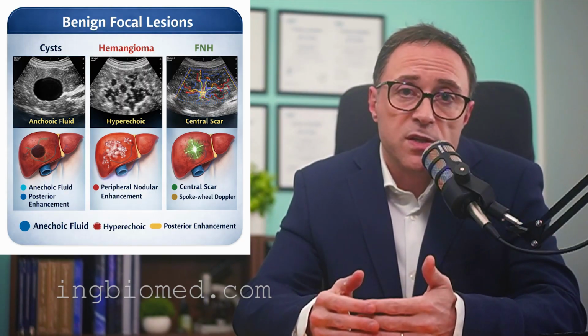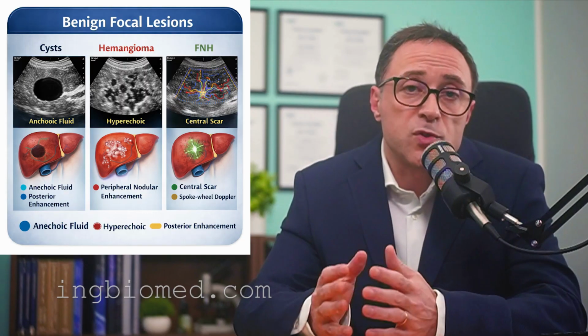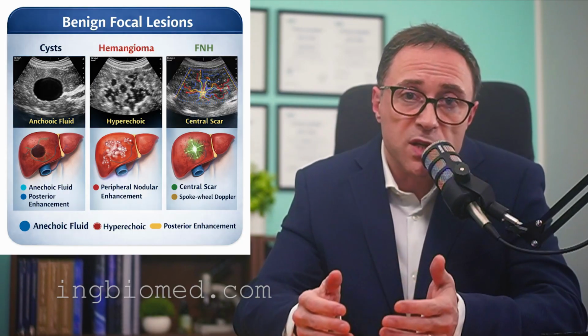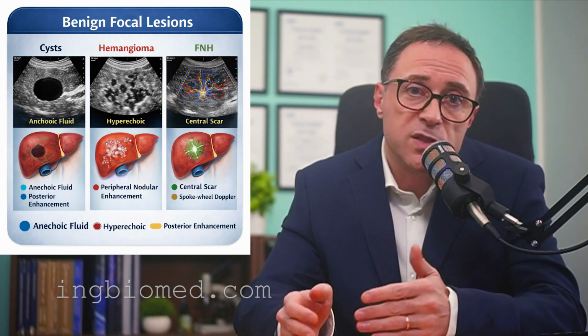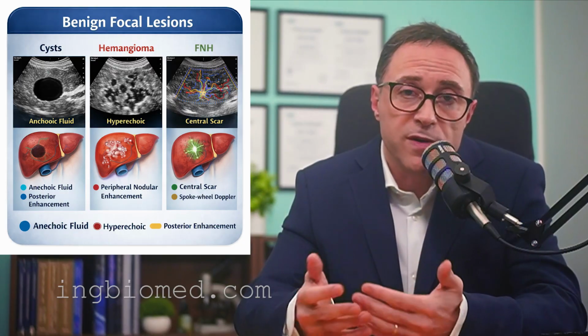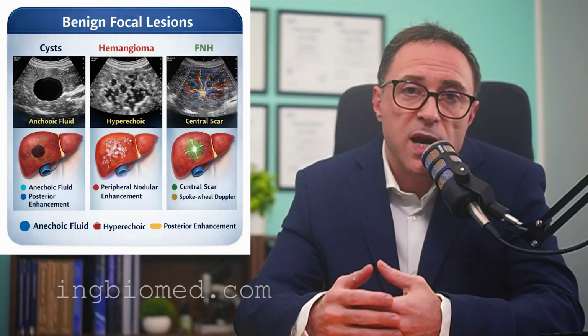Parasitic cysts, such as echinococcal lesions, demonstrate a spectrum of appearances depending on stage, from thick-walled cysts to daughter cysts and detached membranes. These findings require careful evaluation and appropriate clinical correlation.